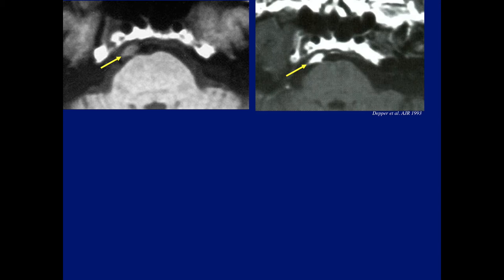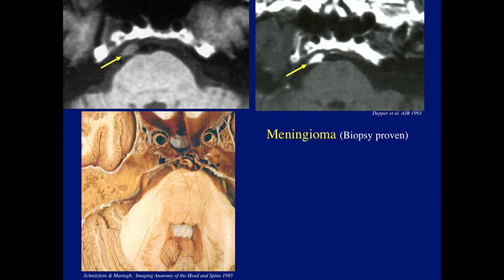Another condition involving... Dan and Gino mentioned schwannoma. Another possibility. Remember, when you mention schwannoma, you should think of something else. Again, as Nate mentioned, meningioma. I don't think we can really differentiate, but this case was a meningioma. It was proven by biopsy, case from the literature.